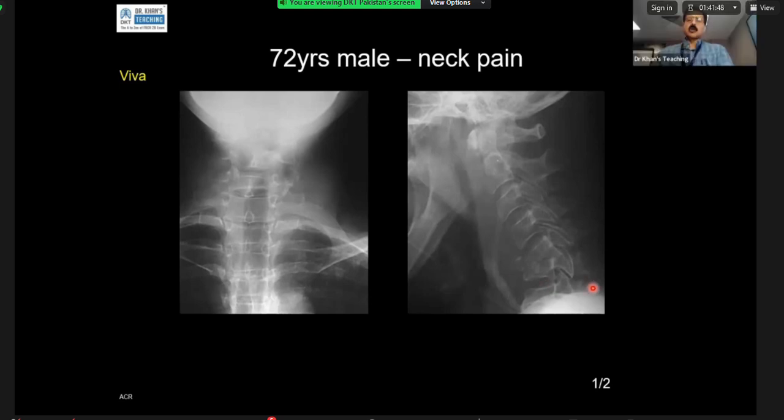Excellent, well done. So in this particular case, what is happening is that there is a collapse here. You can imagine that there was an intervertebral disc in between, which is gone, all eaten up. The vertebral end plate, inferior and superior, is partly eaten up. There is a bit of localized kyphosis. And when the disc space is gone, eaten up, it is taken as a sign of infection. Remember that. I was looking for this finding to be pointed out, which the candidate did well.